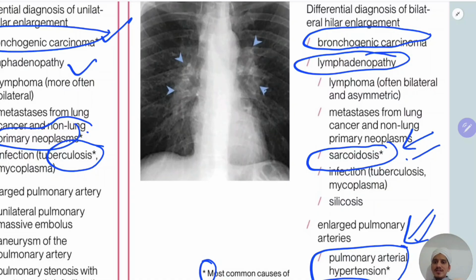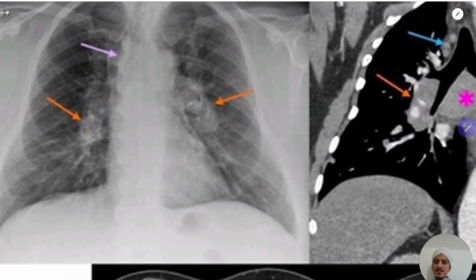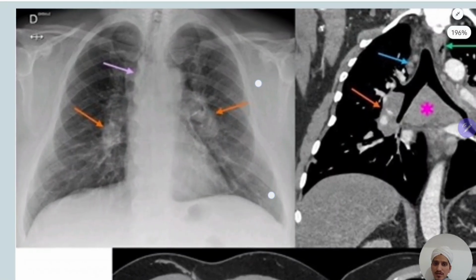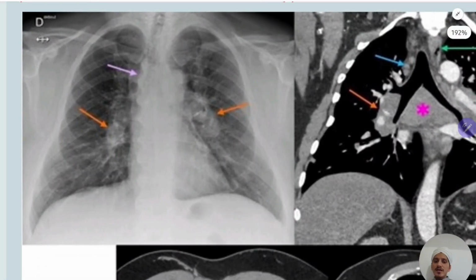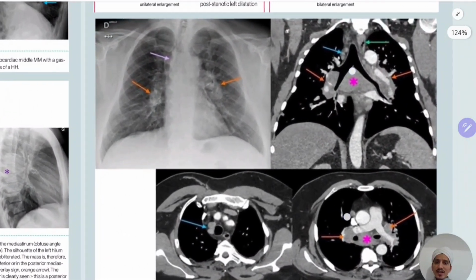In sarcoidosis, you will see a sign known as the 1, 2, 3 sign. So we will discuss that. See here it is bilateral. By seeing only, you can make out. So bilateral hilar enlargement, you are able to see there is no cardiomegaly. Bilateral hilar enlargement is there.